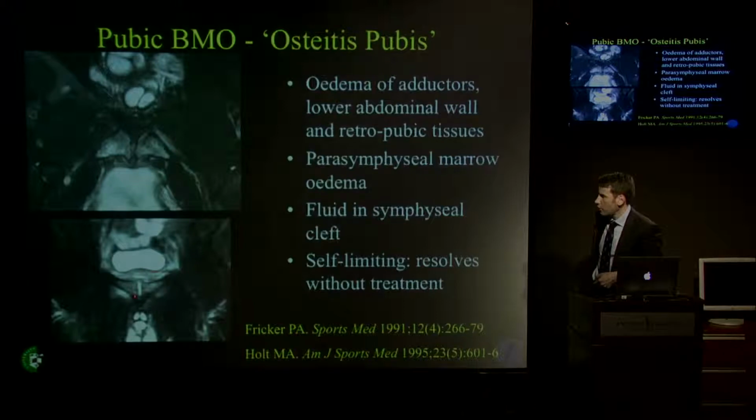It's like a halo around it. You can see fluid, you can see that remodeling, which again doesn't help us, and this bone marrow edema. And this seems to be present in younger players, usually academy players who have been overtrained, and all that happens is we do the scan, we say, oh, that's what we thought, and they shut the player down. It's almost like a stress injury through this area. And again, one of the examples I showed you earlier, they didn't shut him down and he proceeded to fracture.